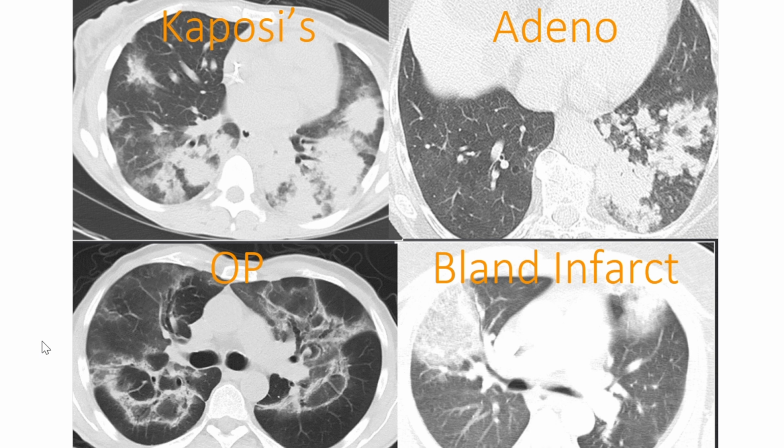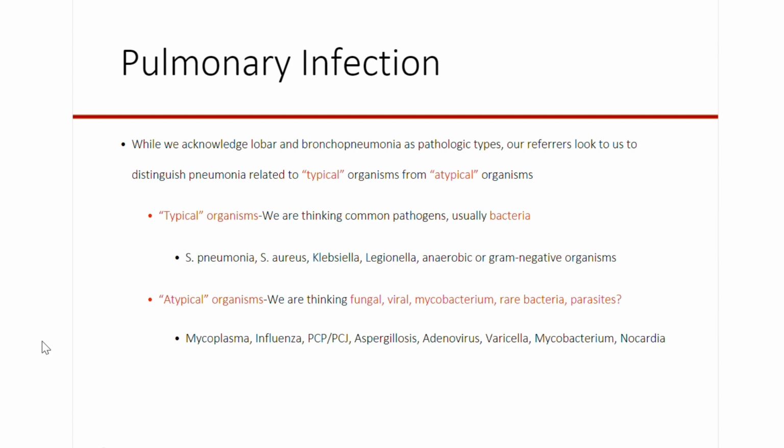Lastly, this is that adenocarcinoma that looks like a pneumonia. This is a mucinous adenocarcinoma. Obviously, this is someone who we said this is a pneumonia, follow up in 1 to 3 months. It didn't get better, and eventually they bronched, and it was mucinous adenocarcinoma.